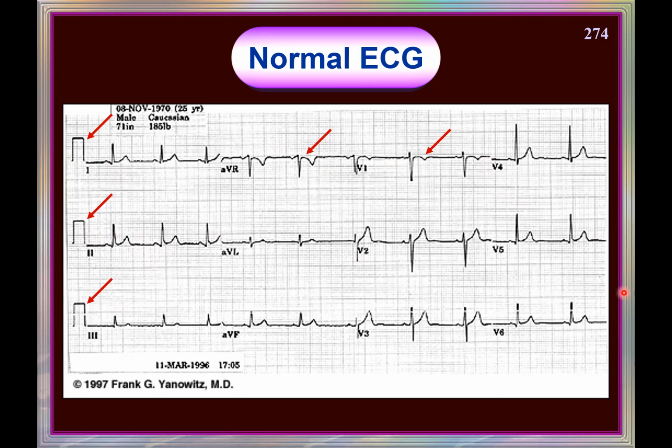And the other observation is that RR intervals must be constant. Look here: this and this, this and this, next RR intervals. RR intervals are constant. A standard baseline of the ST segments and constant RR intervals.